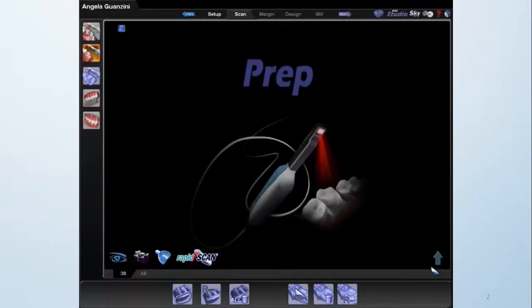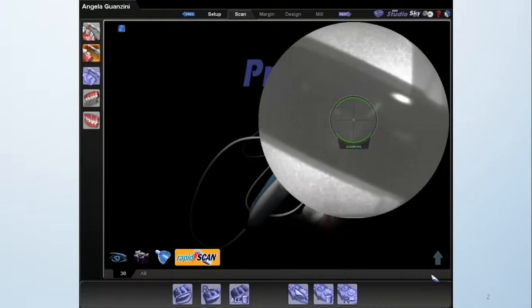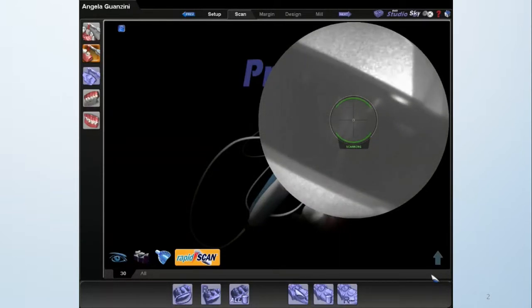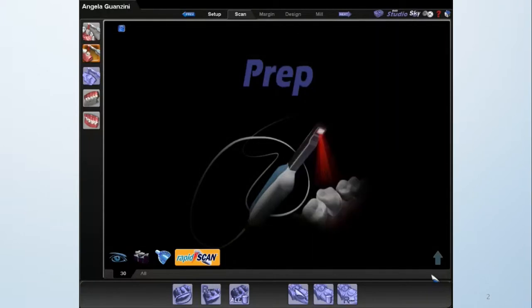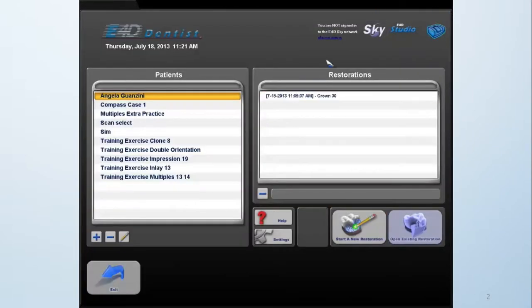So this week is kind of a hodgepodge of topics, we'll say. I've pre-scanned in a case, or was about to, and it was kind of funny. I turned my cart on and I noticed a circle on my screen. Now, we all know that we generally see a square. And so I thought, aha, this is a great thing to start talking about. When that circle was up on the screen, what happened is my cart got switched into SD mode, and I'm running an HD wand.